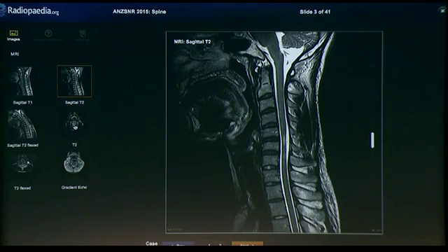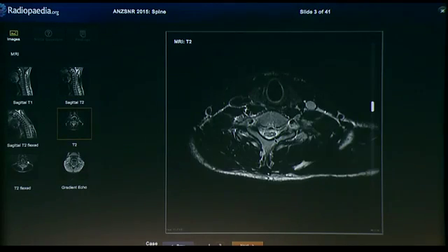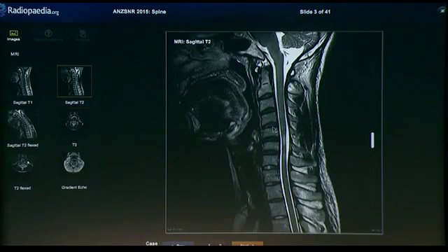We have heard about a few causes of anterior horn cell predominant signal abnormality, but really this isn't an acute presentation of ischemia or any of those infective causes of anterior horn syndrome that we've heard talked about. So really the findings are quite suggestive of Hirayama disease. Hirayama disease is a compressive myelopathy that is positional.